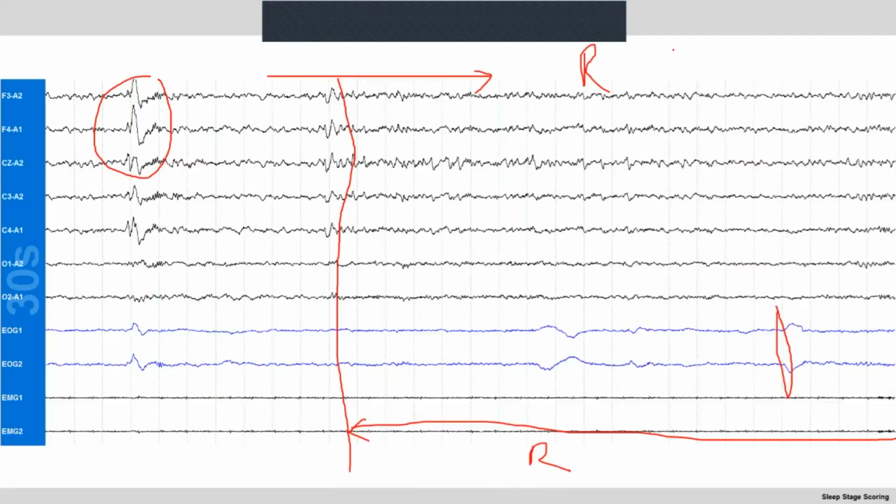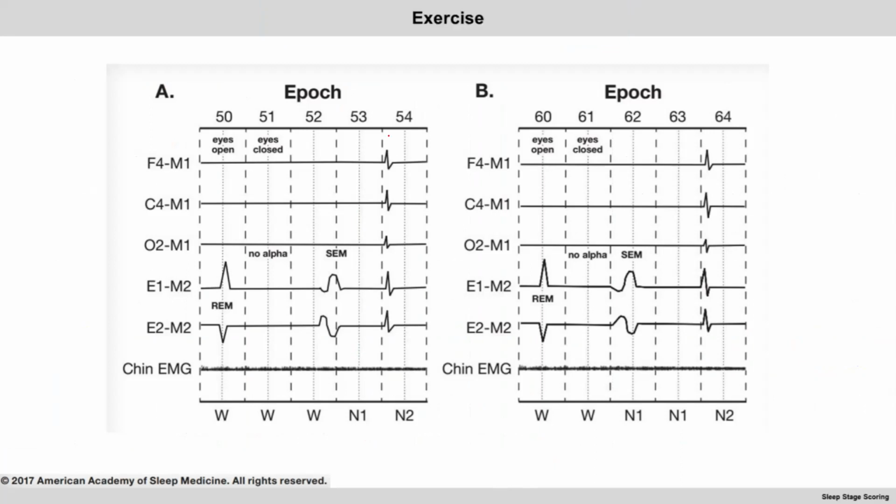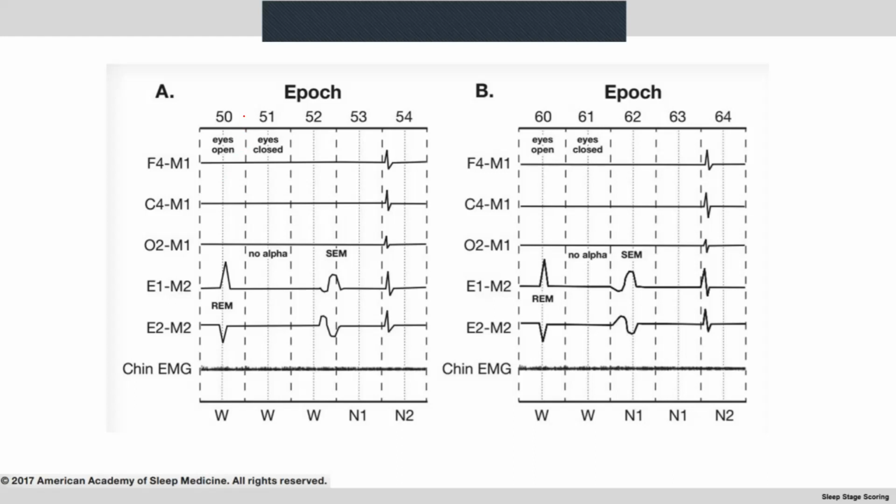So let's do some exercise on what we have learned till now. This is 30 seconds, next 30 seconds, next 30 seconds. It's like if you are going to sleep at 10 o'clock. This is 10 o'clock, 30 seconds, 1 minute, 1.5 minutes, 2 minutes, and 2.5 minutes.